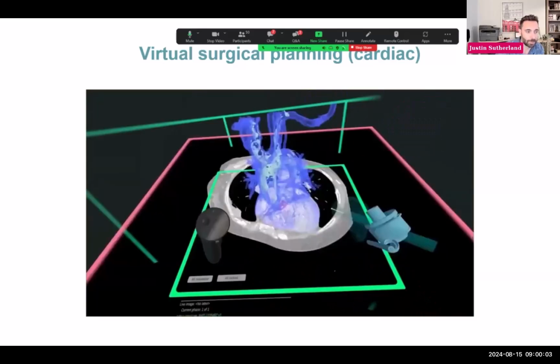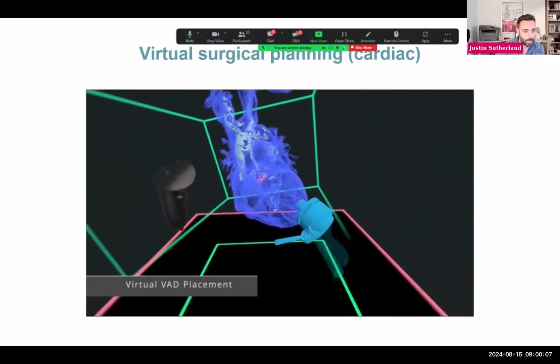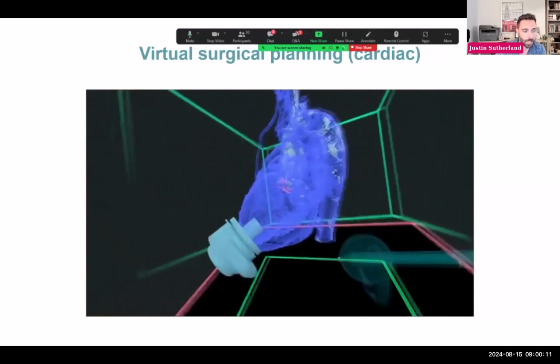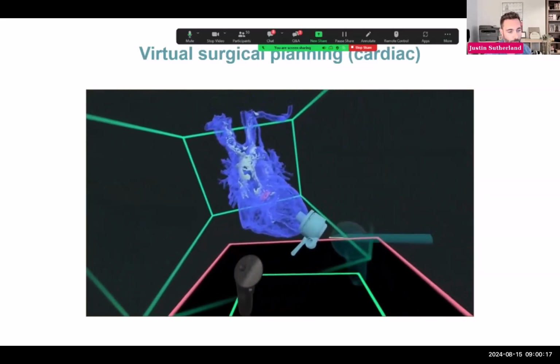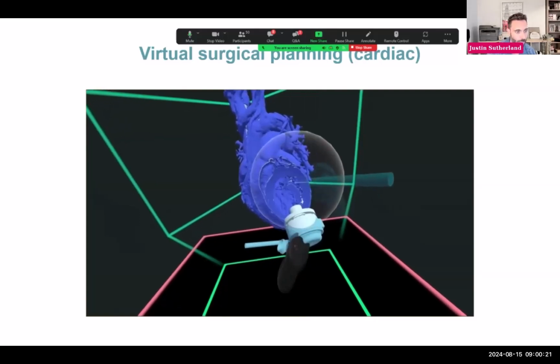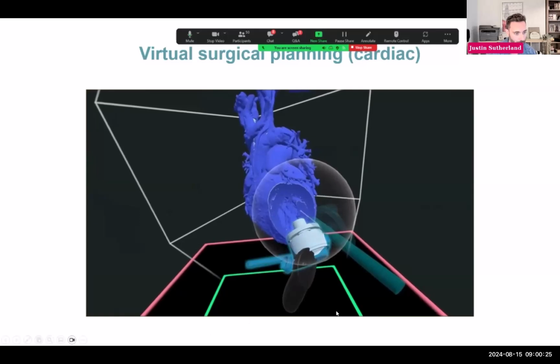So the nice thing about this type of activity is that you can just place the items that you're interested in and visualize or measure the fit of them. So you don't have to rely on some of the abstractions that are typically done in these virtual surgical planning procedures, where you're measuring things or creating landmarks and then using that as an abstracted way to assess the quality of the plan. You can actually just do it yourself and then see how it looks.